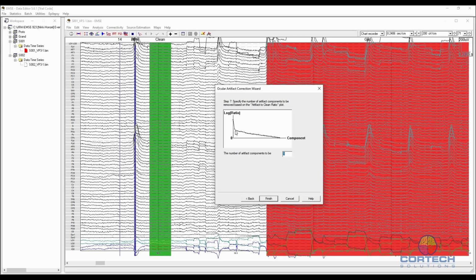And this second one might also be. One thing to notice, I think, as I recall, you and Lloyd, because Lloyd was demonstrating this, and Nikki, you were the participant, but I think you were also looking at the data. So I think your eyes weren't looking straight ahead, perhaps.